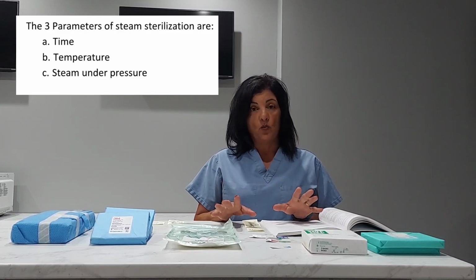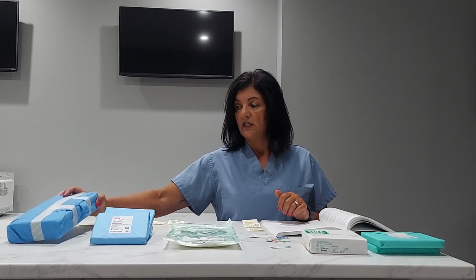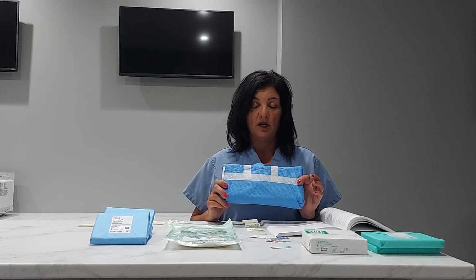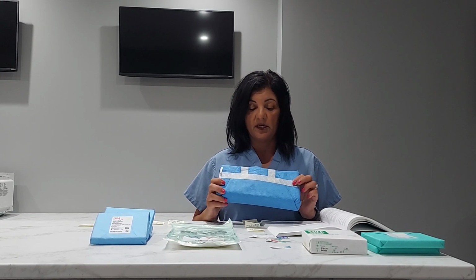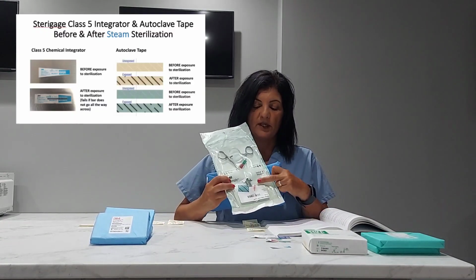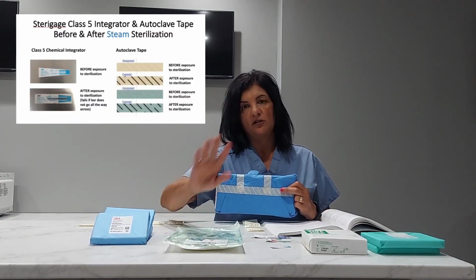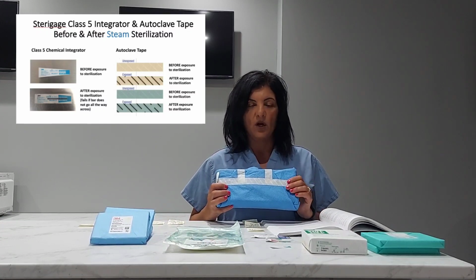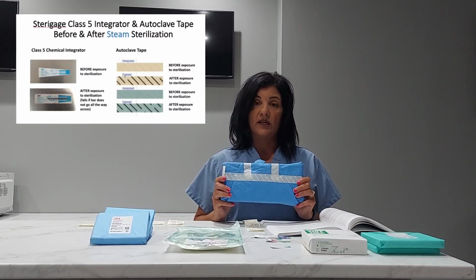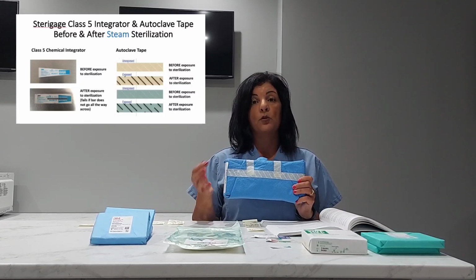So your class 1 is your exterior steam tape. There's many different brands on the market. There's the cream colored, there's your green color. So there's different colors of tape, but they start out one color. Once they've been exposed to sterilization, they are reacting to being exposed to temperature or heat.